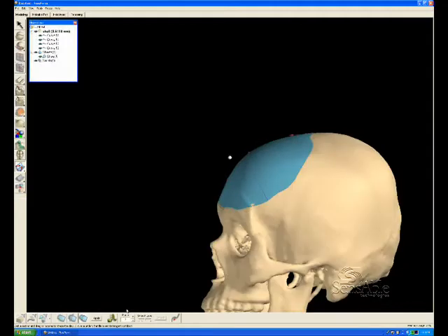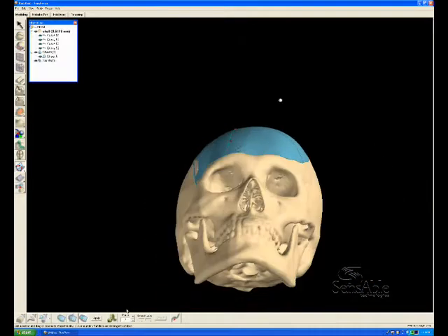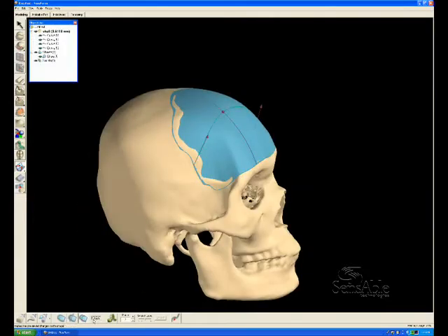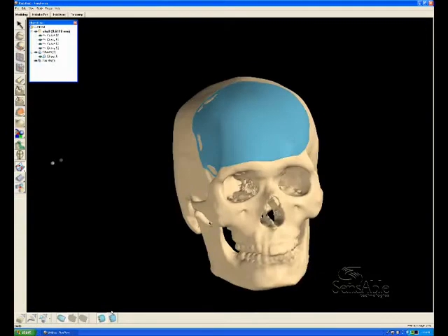And that is the reason that the curves were drawn offset from the beginning of the defect area. We want to be tangent to the parts of the skull that are not affected by the wound. Once a proper curvature has been established, we can apply this shape patch and then thicken the patch into a plug.